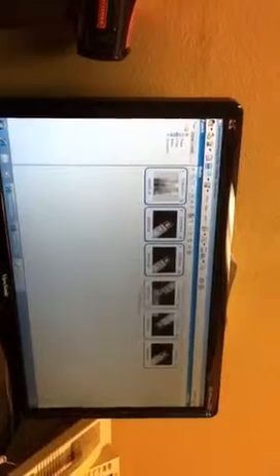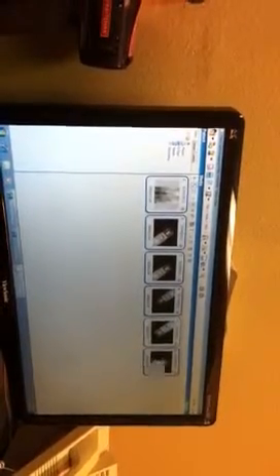Let's say you're going to work on a bunch of images. Let's say you've got 6 images here, and you're going to work on 4 of them. Rather than clicking on 1, 2, 3, 4 like that, what you can do is click on all of them and just eliminate these 2. You see? So it's 2 clicks. So this is select all. This is select none. This is the garbage can.